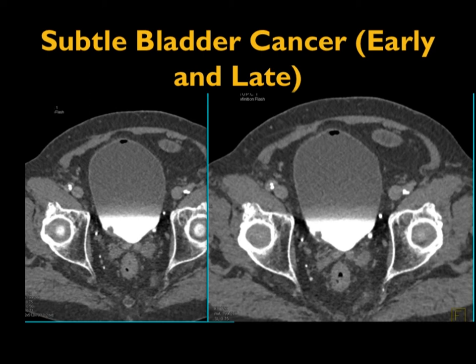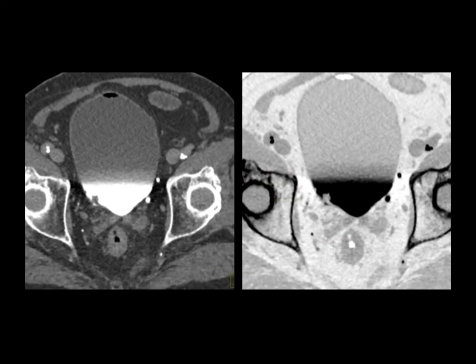Other times it may not make a difference. The key, of course, is good bladder distension, however you do that, and that becomes very, very important. And here's just one more example of that.